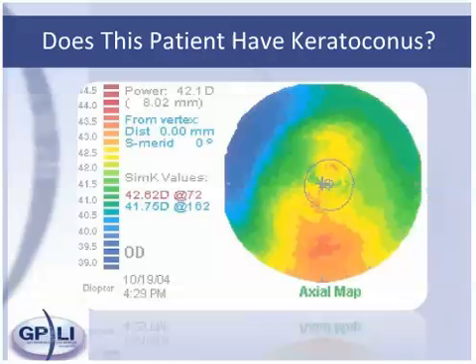In my practice, I have had numerous patients come to me with the diagnosis of keratoconus. However, when I analyze the corneal topographies, I'm not so sure that is the diagnosis. This college freshman came to me with the diagnosis of keratoconus. This patient was considering changing her major or dropping out of school because of the progressive nature of this disease and her uncertainty of the situation.